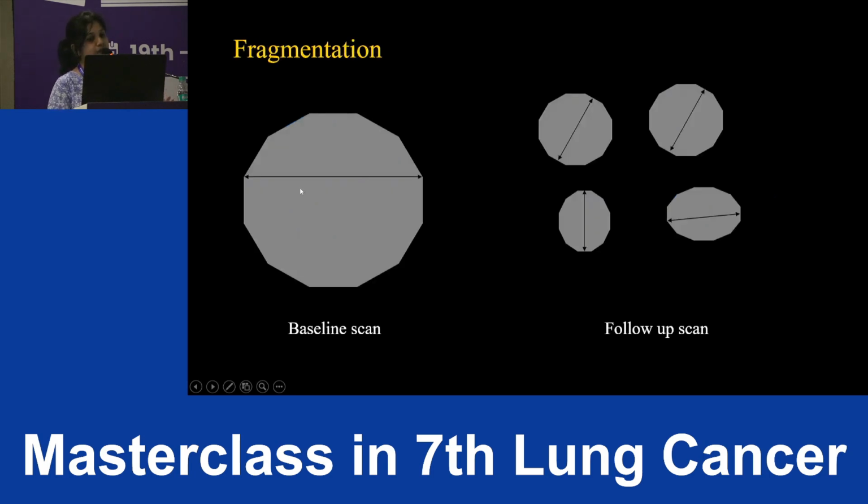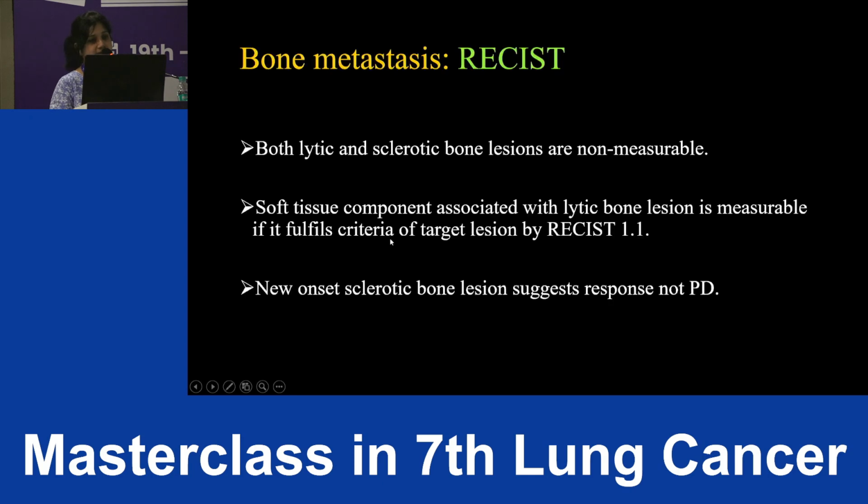Now, if a tumor from the baseline scan on a follow-up scan has fragmented, then you have to measure the long dimensions of all the fragments, add them and compare it with the baseline scan longest dimension.